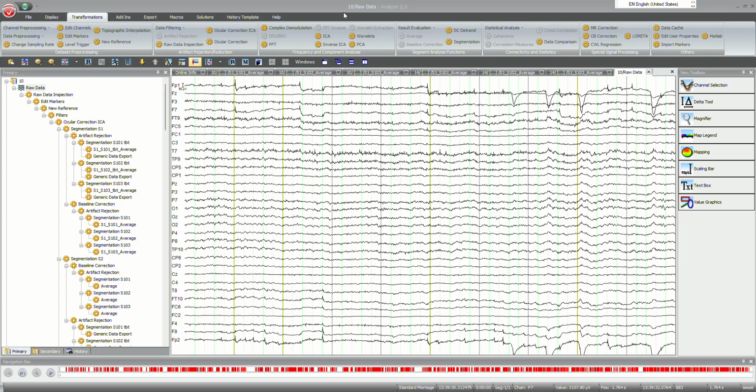So the first thing we need here is the legend, the key to the markers, to our EEG markers or triggers. These are codes ranging between 0 and 255, or rather between 1 and 255, that code for certain specific purposes.